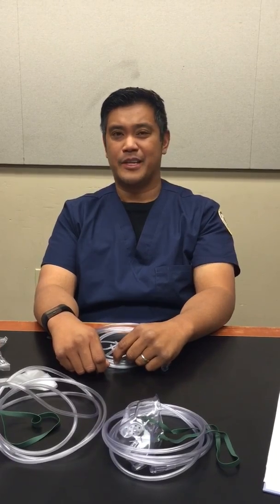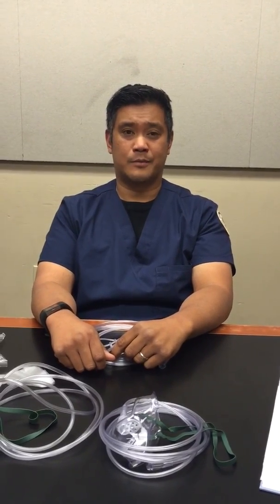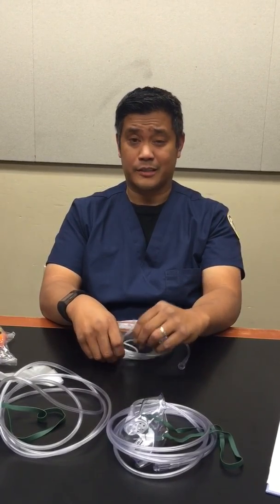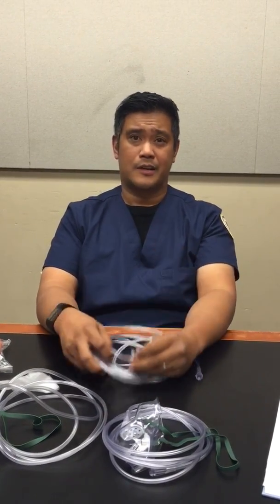Hi, my name is Richard, and I'm here to talk about some oxygen therapy devices. We'd like to first start off with a nasal cannula, which is this device right over here.